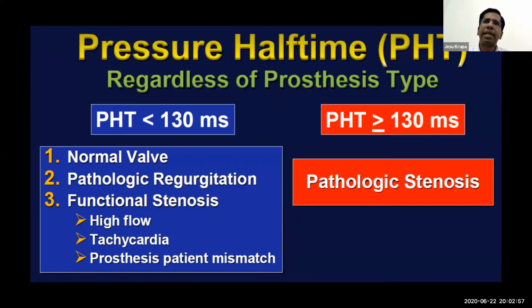We can also imagine what the shape of the inflow trace will be like. In the aortic valve, we said that the more rounded it becomes, the more the obstruction. Likewise here, the less steep the E-wave deceleration slope becomes, the flatter it becomes, the more the chances that there is obstruction. Anyway, we'll look at examples, and we will understand it better.